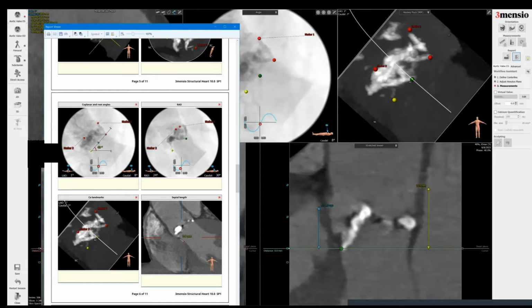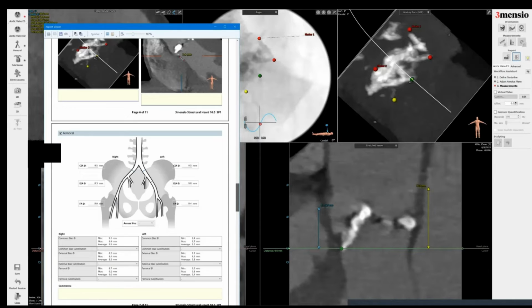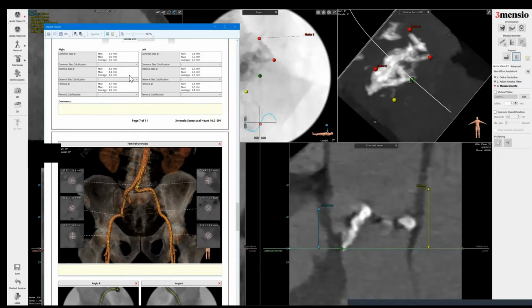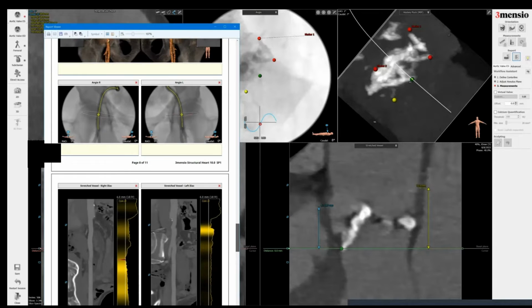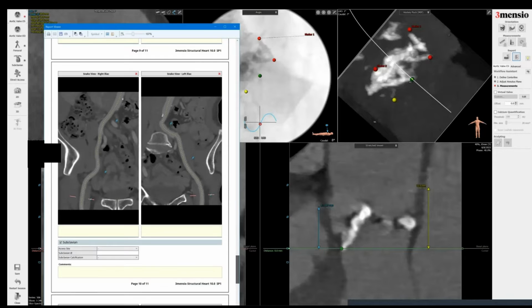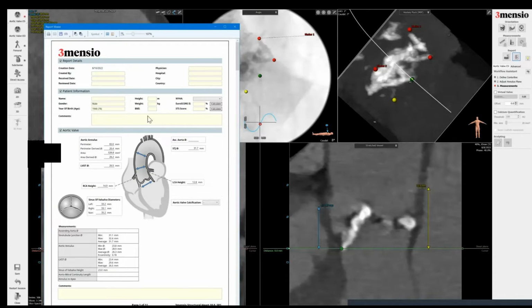And you can see that now, the fluoroscopic view, the calcium landmark, the septal length. So everything I showed you is there, and you can see that this is the access now. You can see the measurements at the different points of the artery, access point on fluoro, stretch views, and finally the arch view. And when I'm done, I save it to a PDF, and you can then send it anywhere and to anyone who needs to review this.